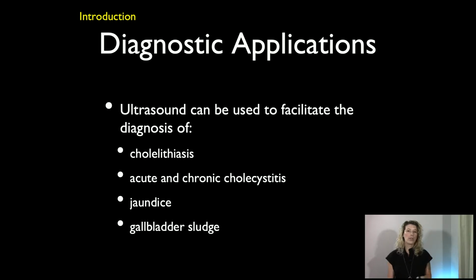So we're going to talk about using point-of-care ultrasound for diagnosis of gallstones, cholelithiasis, cholecystitis, whether it's acute or chronic, some ways to differentiate causes of jaundice, and then some specific mentions about gallbladder sludge, which is a little bit confusing for people.